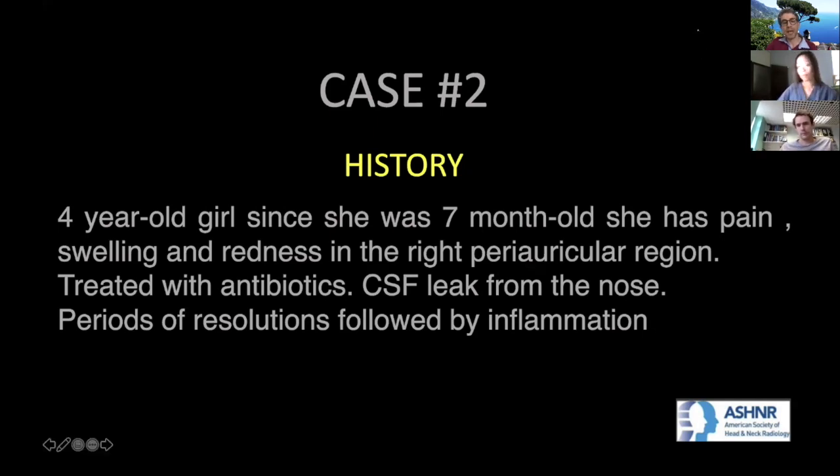Yeah, so that's very interesting. And another thing to remember is the difference between a cochlear hypoplasia, where there's a cochlea that stopped during the development and that can have or not abnormality in the internal partitioning, in comparison to the incomplete partition type 1 to 3, that by definition have a normal size. So the development was normal in terms of size, but abnormal in terms of internal partition. So probably blood again during, it is a theory, during the development coming from the internal auditory canal.